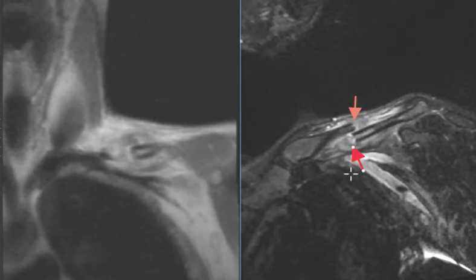And here it is. So this is a view where this is the outside, lateral side, this is the medial side. We see the shaft here. We see the displaced fracture. There's bone displacement by one shaft width, and a little bit of bone overriding. So you're going to have to see the orthopedic surgeon and have this pulled straight, get the alignment back.